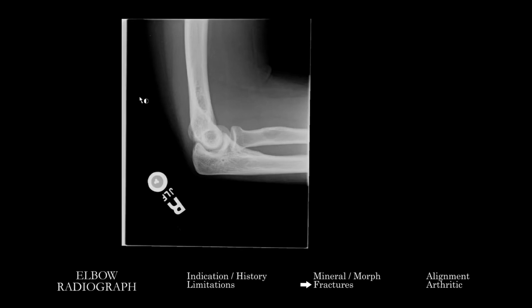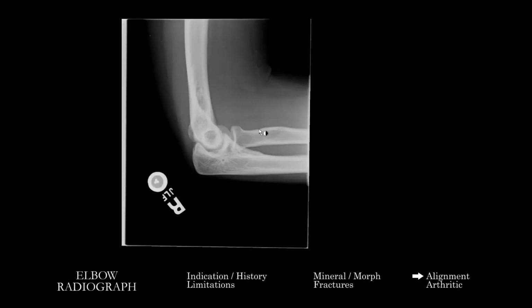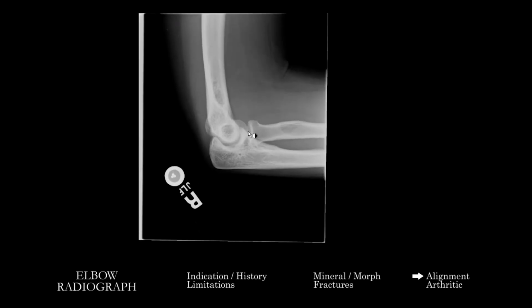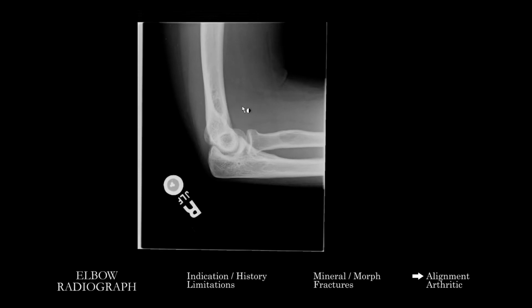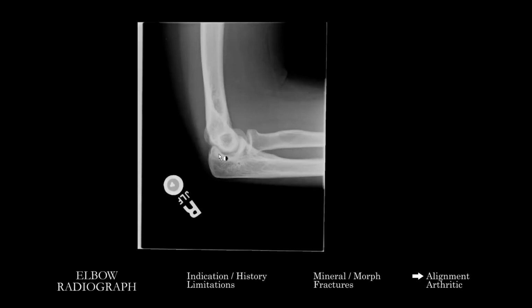Both in adults and in kids, at least just having a sense as to the radiocapitellar line, if that's well aligned, the anterior humeral line, and then looking at the radiocapitellar articulation, the ulnotrochlear articulation on each view, looking to make sure that those are well opposed and that there's no subtle abnormality there. You want to also remember that, in the setting of dislocation or various injuries which have an impaction-like mechanism, the coronoid process could be a subtle fracture that you want to be able to pick up in those sort of circumstances.